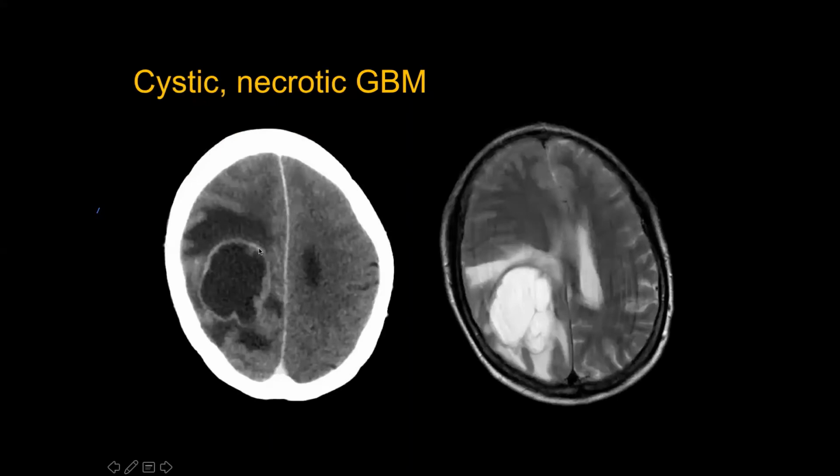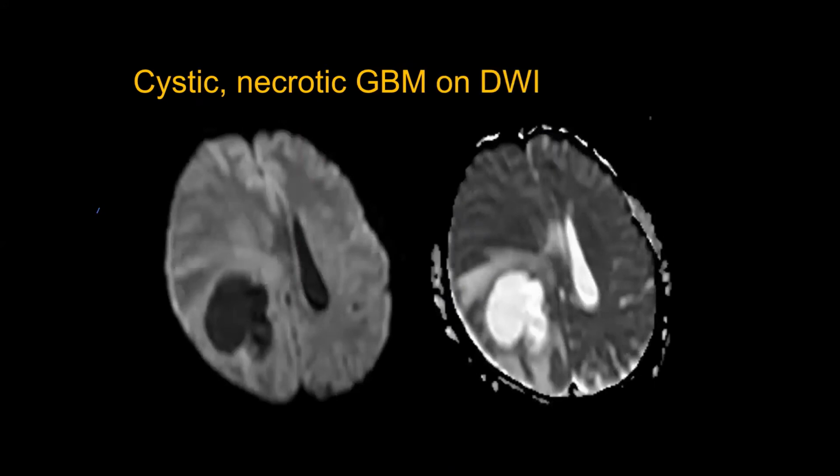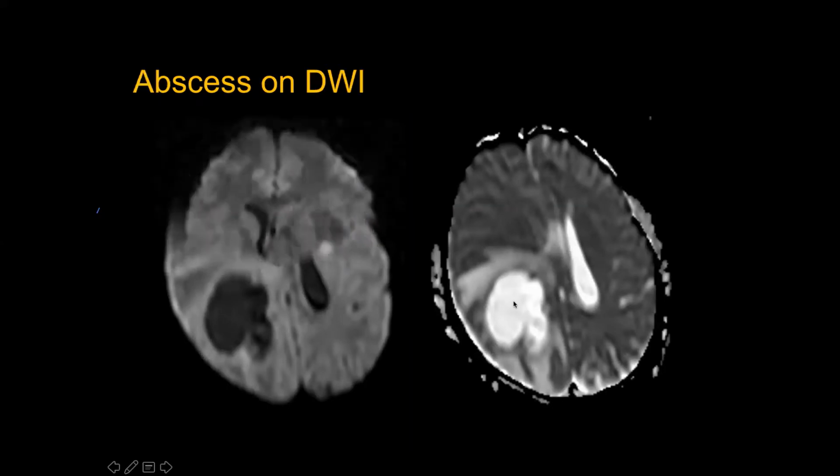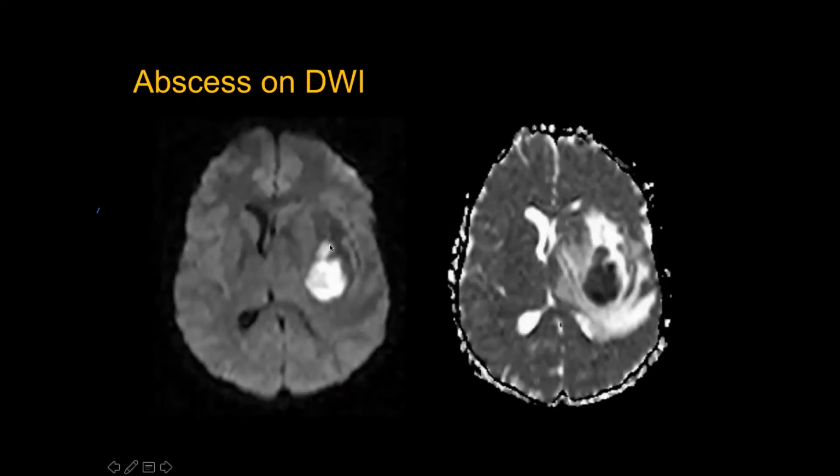You can have a cystic necrotic GBM. This looks just like a cyst with lots of edema. And post-contrast shows very thin rim enhancement. So GBM is a great mimicker of everything else. And diffusion-weighted imaging shows that this is free diffusion: black on diffusion trace, bright on the ADC map. Versus an abscess, which is high on the diffusion trace and black on the ADC. Okay.